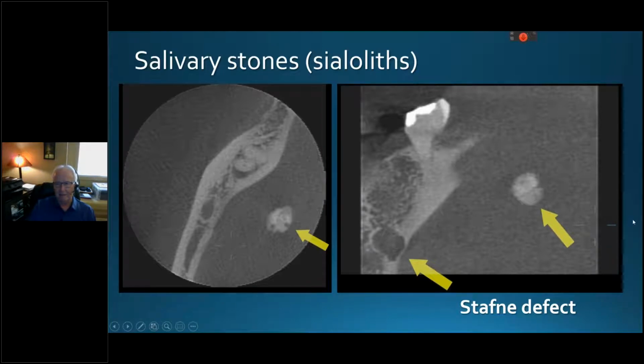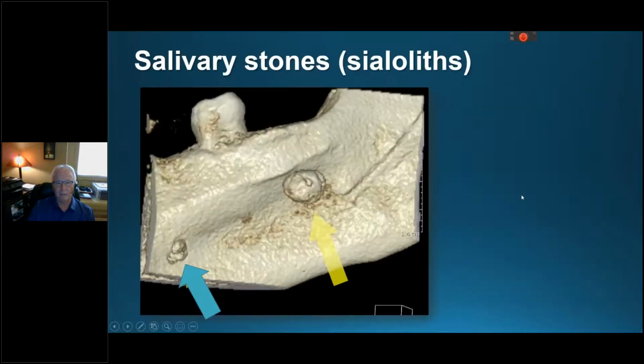But the beauty, again, and I think I talked about this in the first two courses, is that I always try and do the best and most explicit imaging I can for the client. I put this into the 3D reconstruction mode, which is very simple to do in the third-party software. I get cases from every manufacturer, every machine, so I have a different third-party software that allows me to do all of these particular images. And most of this can also be done in the Easy 3D Dental, so you need to ask your reps about their software package as well.